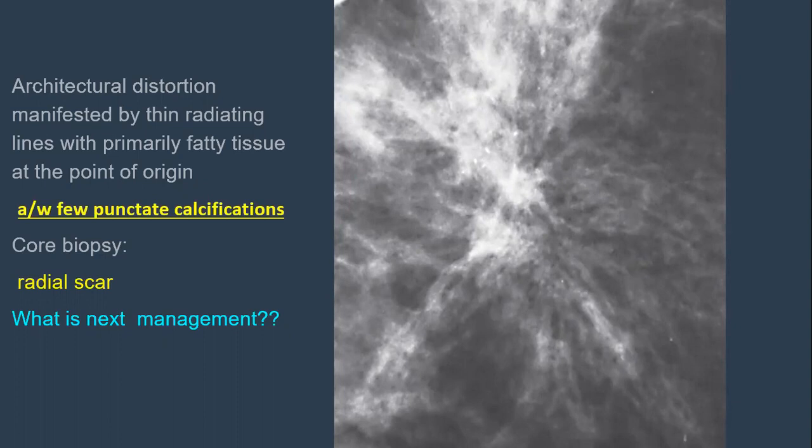I told you that these are borderline lesions, concerning lesions. They are not per se malignant, but are concerning because they are associated with underlying malignancy. Generally, after core biopsy reveals a borderline lesion, excision biopsy is recommended, to look for any underlying malignant lesions or upgrading of the lesion. We discussed that in the introductory lectures.